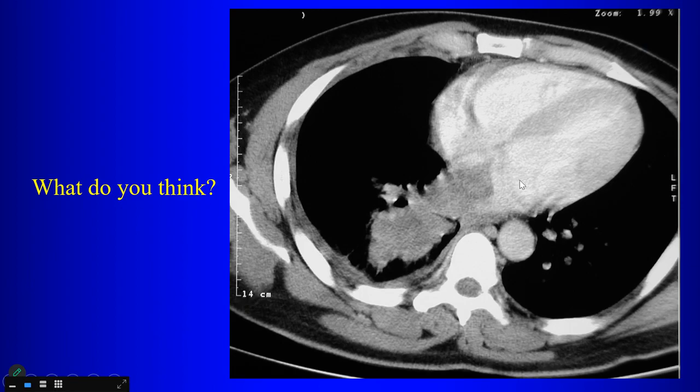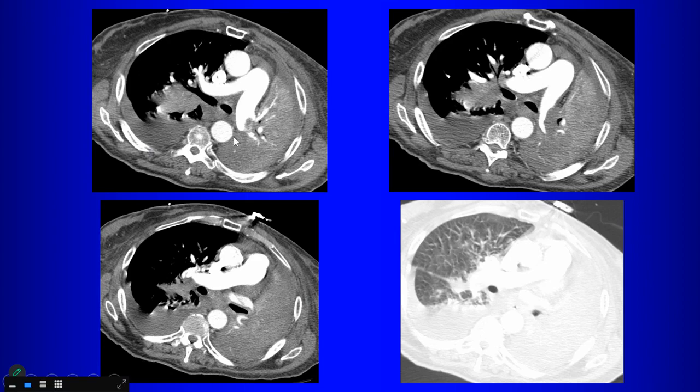So on echocardiography, of course, they're only going to see the lesion in the left atrium, right? They're not going to see the lung tumor. So actually, lung cancer invading the atrium is probably more common than myxoma. So any patient with a tumor in the left atrium, you want to make sure that it's not something invading into the left atrium from the adjacent lung. So lung cancers can do that. Okay. Here's an example of lung cancer invading the left pulmonary artery. Okay, so lung cancers can invade blood vessels.